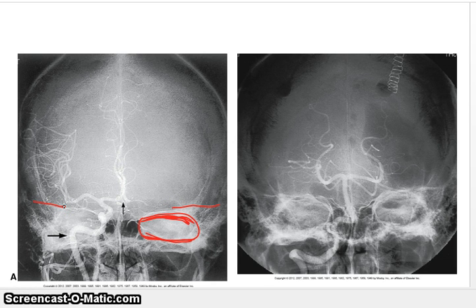The temporal bone has a chunk of bone that projects medially into the brain, and that is called the petrous portion of the temporal bone. That petrous portion is the densest bone in the skull, so it shows up bright white. Like I said, it's a whole chunk of bone, but you want the superior ridge of that chunk, so you want the petrous ridge to be superimposed over the supraorbital rim.